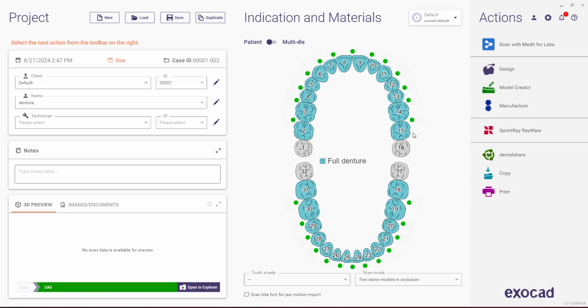what I was going to show there is what I would have to do is open up that denture base and the teeth, right, and combine those. And then I would have to Boolean subtract out that internal surface to make this into a one piece, and now that would be saved. If you want to make a monolithic denture, don't do it in this module. I'm just telling you the basic crown and bridge module is my preferred method for doing that. So I'll quit with this one here.